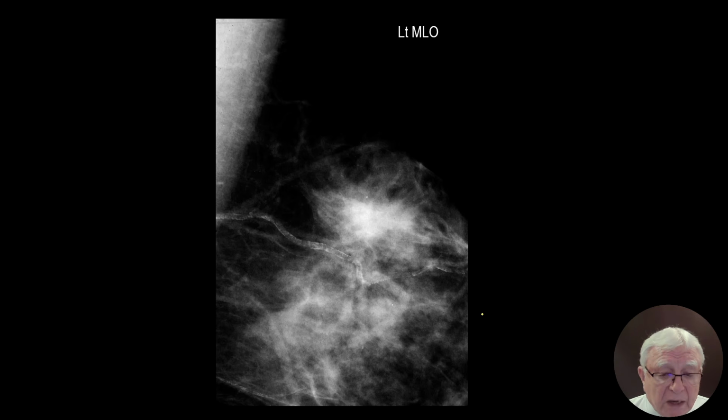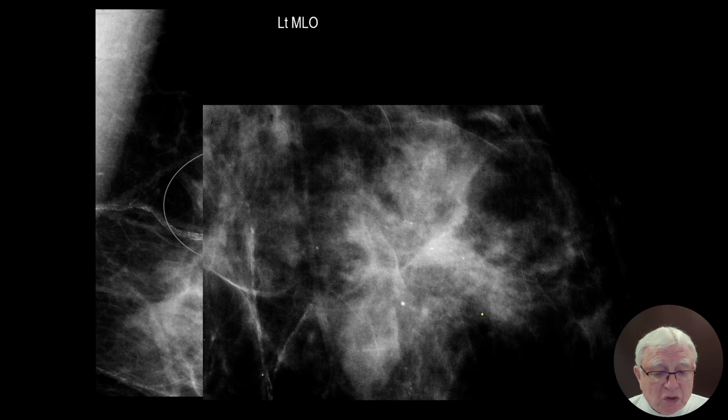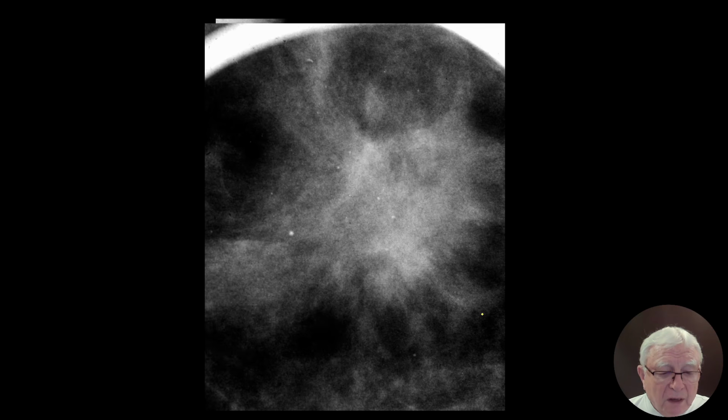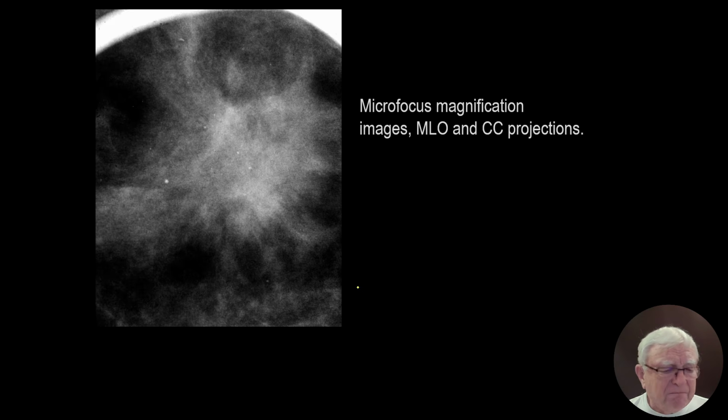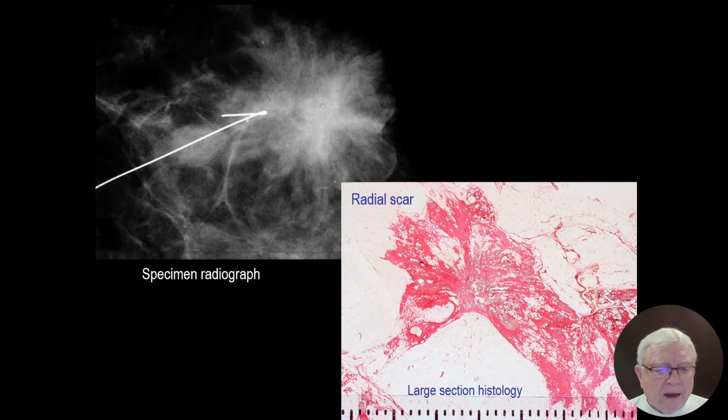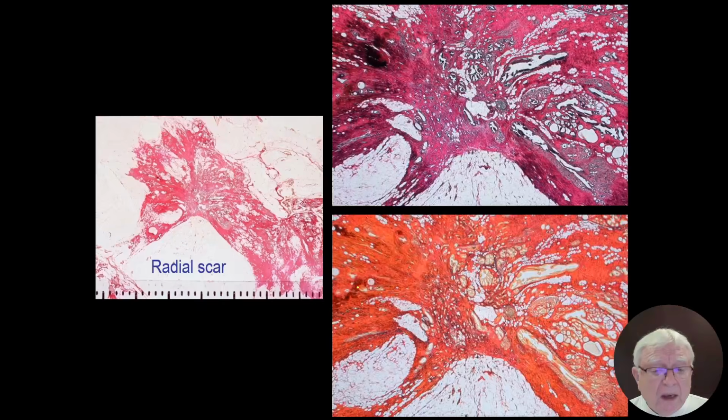And there is one more thing. You know, the cancer is a three-dimensional object. This one, you change it from projection to projection, and it changes. And these calcifications, don't worry about them. They are skipping stones in fibrocystic change. Doesn't it have a very big central fibroelastic core? Might not. Take it out. No fibroelastic core. It looks like this.